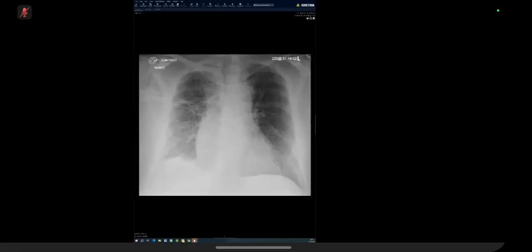So when you start with the chest X-ray, take a few seconds, pause about 5-10 seconds to take in all of it, and then have a little paragraph ready before you start. So this one you see straight away is a typical heart failure chest X-ray. So when you describe it, start from the lungs, start from the most obvious abnormality, and don't start with the pneumothorax, pneumomediastinum bit, because that may be a thing you do in rapids maybe, but not in a Viva description. Don't start with that straight away. I think it's one trick sometimes we use just to make sure we don't miss a life-threatening abnormality, but saying it doesn't seem as smart as we want ourselves to sound like.